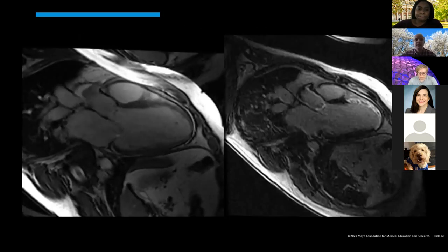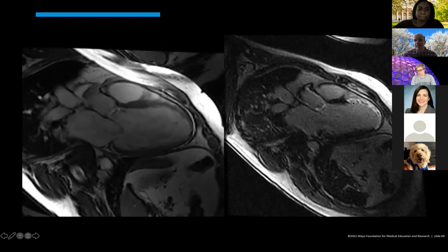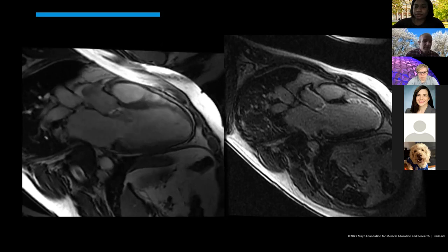And here's the cardiac MRI from this patient. You can see very hypokinetic, akinetic anterior wall, anterior septum, true apex. It's not thickening, it's not squeezing. And then on the late gadolinium enhancement images, you can see a transmural infarct. And so the question might be, is that going to get better at 6 months? No, that's not going to get better.